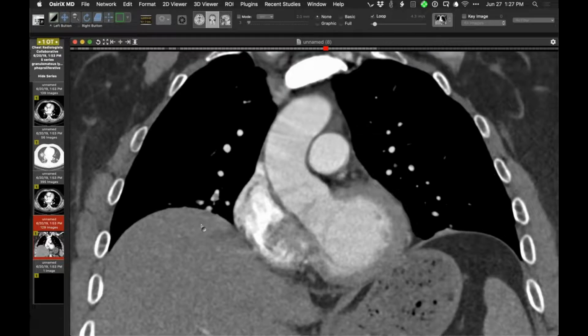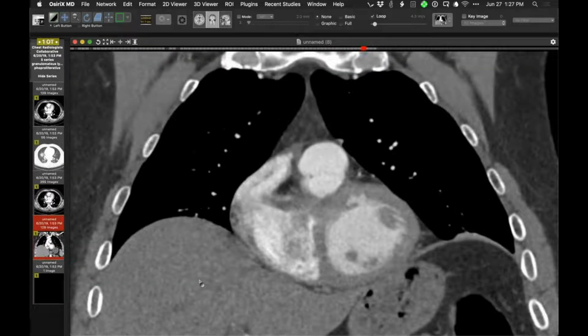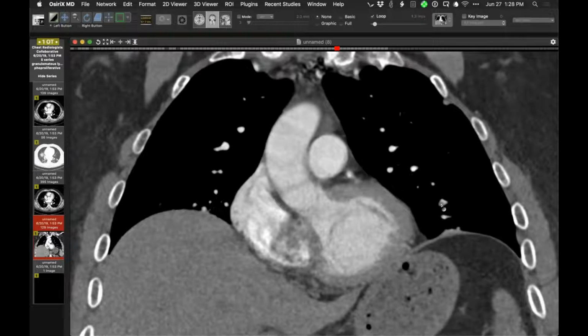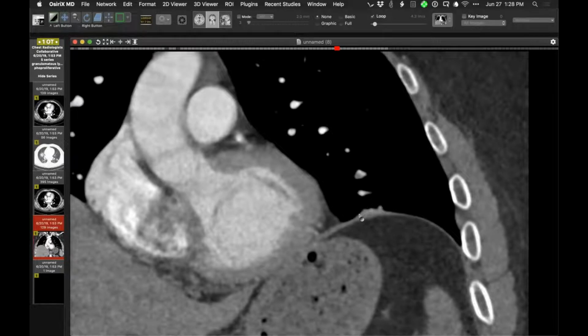It's kind of a case where the more you look, the more you see. But I think I've seen that before with sarcoidosis, where presumably just lymphoid tissue is expanded by granulomas, like right there, for example. I'll just make that one up. Do you guys agree? Do you see that occasionally? Like that?